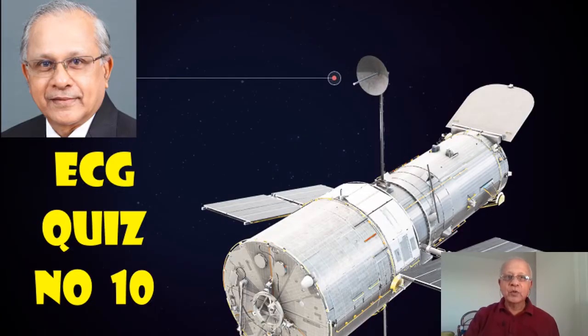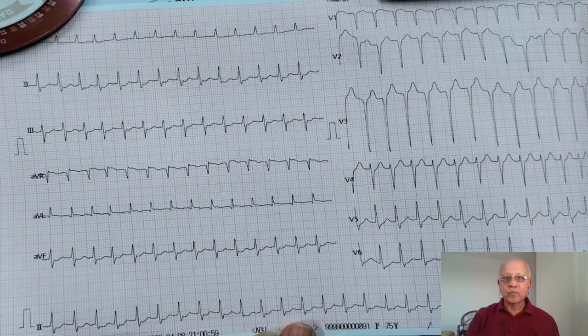Today, I propose to show you two arrhythmias and one 12-lead ECG. So let us go to the ECG straight away without wasting much time.